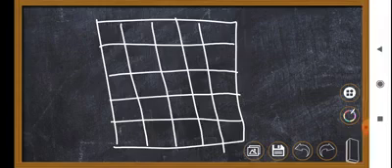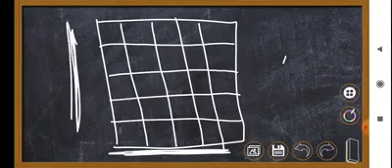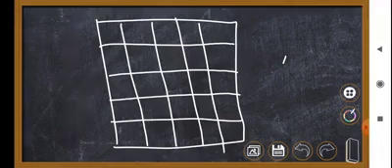As we already know, every ECG comprises small scales and large scales, and each large scale comprises 5 small scales vertically and 5 small scales horizontally. Now, the horizontal plane means time, and the units will also be in time, and the vertical plane corresponds to the voltage of the ECG.